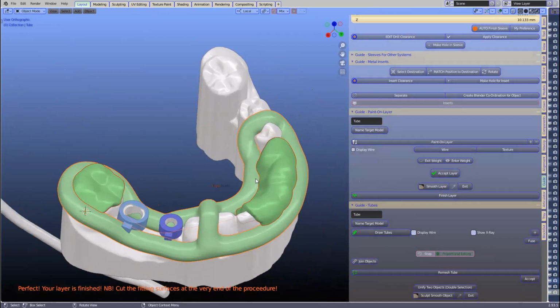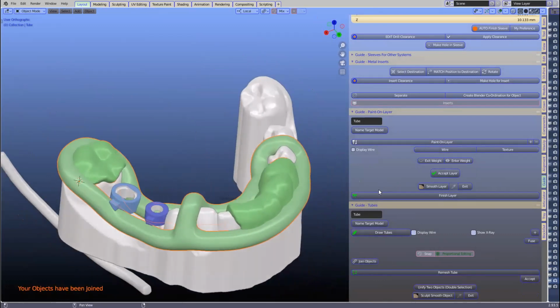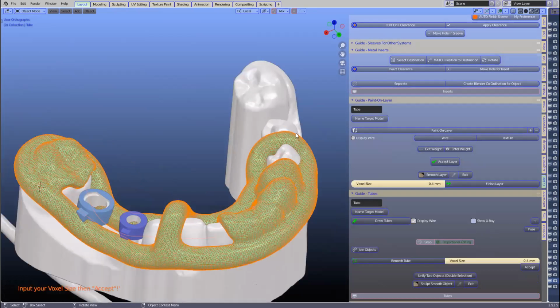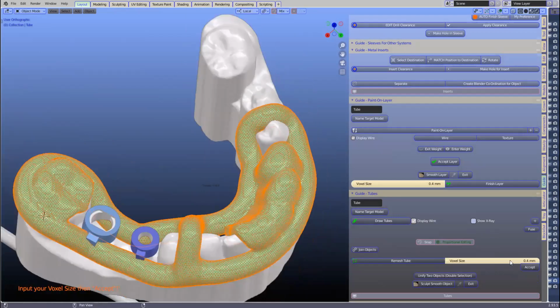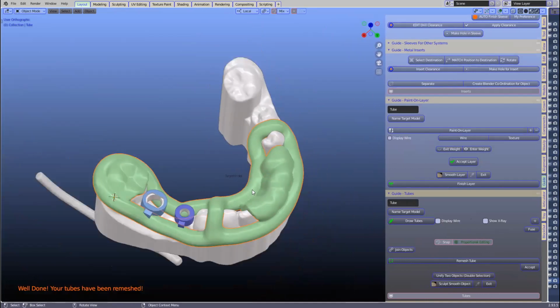so find yourself a join objects, or Wolfgang, like you said, right click and join. I forgot that even existed. Then we're going to remesh this one. So in the tube one, remesh it, which makes this into one object. So we can put layer, tube, layer, one on top of the other. We can design whatever we want to design. Okay, so we've got a funky structure here.